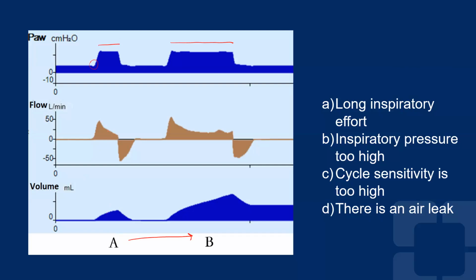So this is a good feature of the ventilators, but it will manifest that there's a discrepancy between the inhaled and the exhaled volume. Now, this doesn't mean on its own that there's a leak. This can be because the next breath started earlier. There may be other etiologies for this, but if you see this consistently, one of the differentials is the presence of a leak. All right.